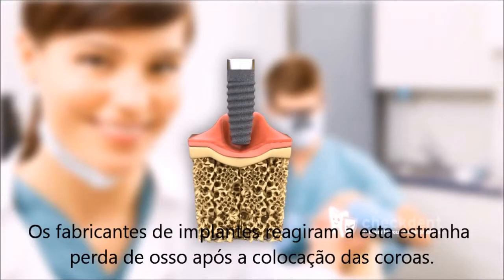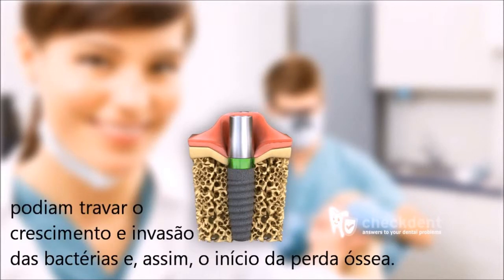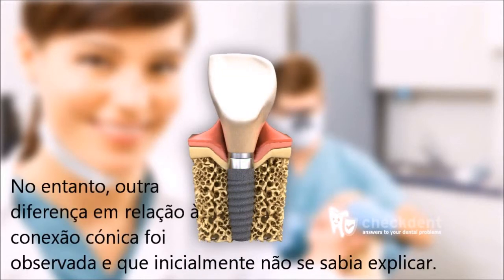Dental companies reacted to this strange loss of bone after the insertion of a crown. It was hoped that by polishing the upper parts of the implants, the spread of the bacterial invasion could be stopped at the beginning of the bone loss, and this was partly successful. Dentists observed yet another difference with conical connections, which initially could not be explained.